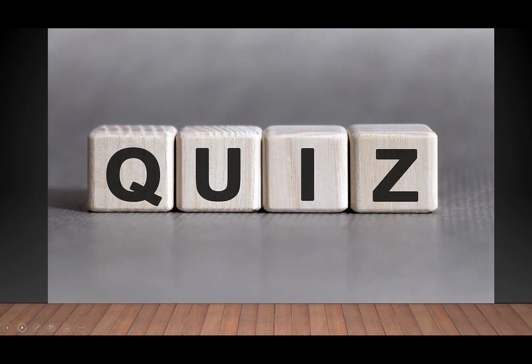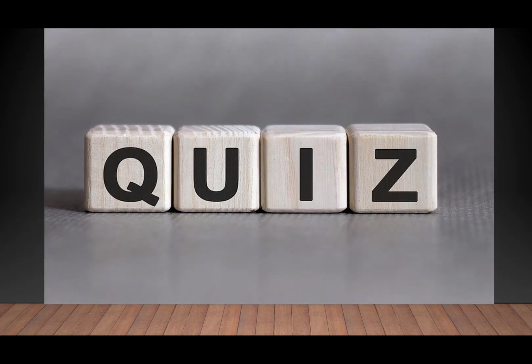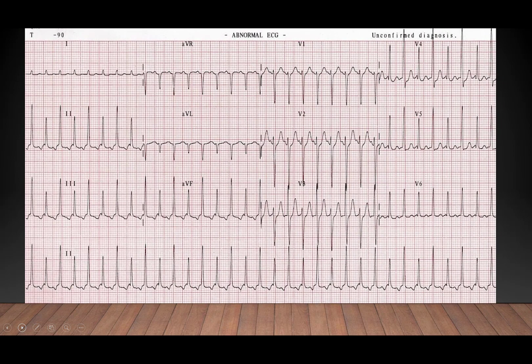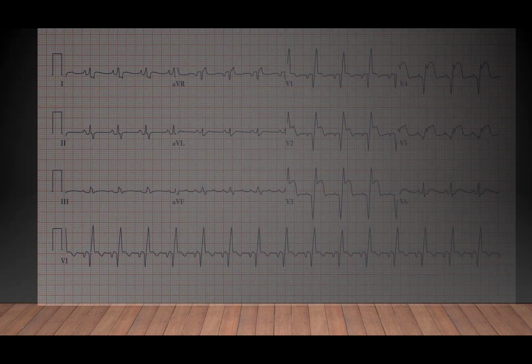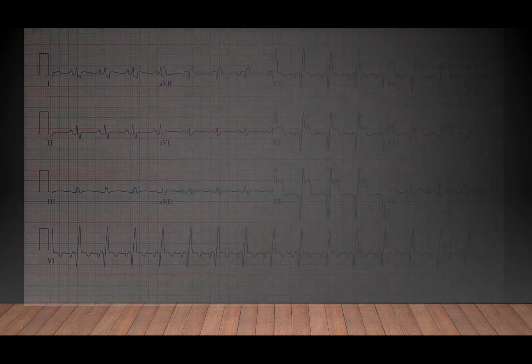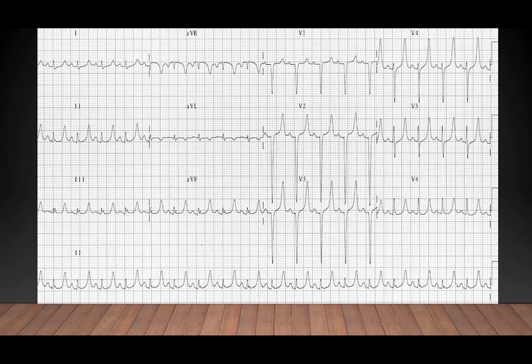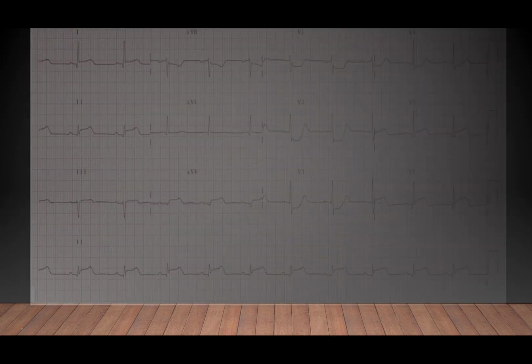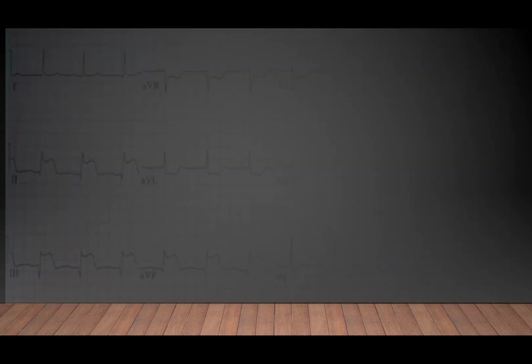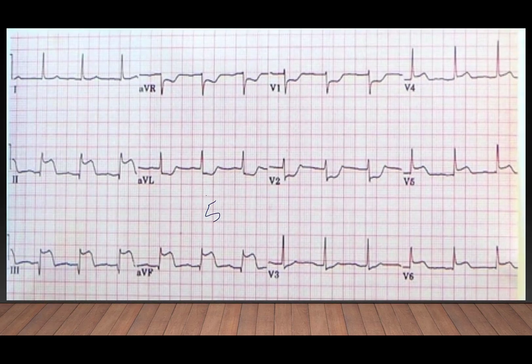Here we have a quiz for you. Hope you can diagnose the problem. What are the ECG changes? The first ECG, hope you can diagnose. The second ECG, the third ECG, the fourth ECG, and the fifth ECG.